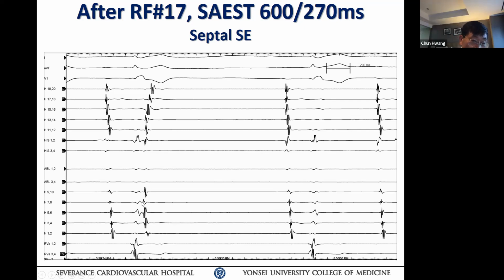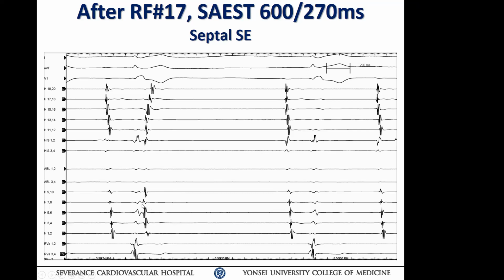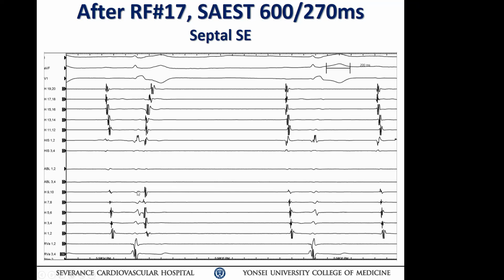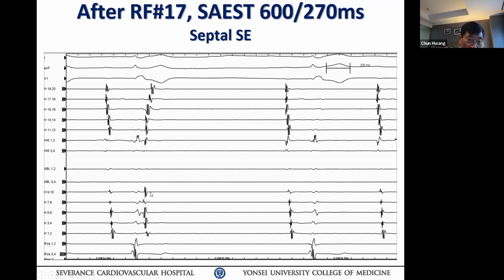Your CS catheter 5, 6, 7, 8 is not a CS catheter? It's a septal? I thought that was your left lateral recording. Am I right? So this is inside the CS you're recording, I assume. Yes, inside the CS. Especially 5, 6 has a small negative potential. Retrograde, the A, go to 5, 6. Drop. Yes, that small one. That's earliest. So your pathway is actually closer to the 5, 6, not to the 7, 8.